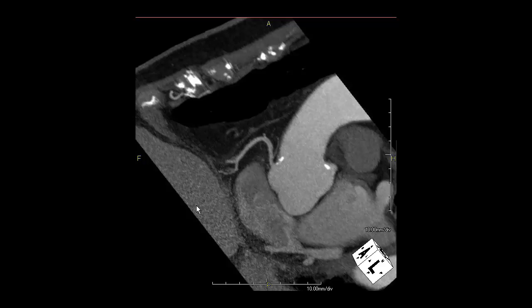In conclusion, this study in the 77-year-old man with an abnormal stress test and some hypertension as well as shortness of breath demonstrates non-obstructive coronary disease in the left main, left anterior descending, and obtuse marginal arteries with evidence of hypertrophic cardiomyopathy and aortic valve sclerosis.